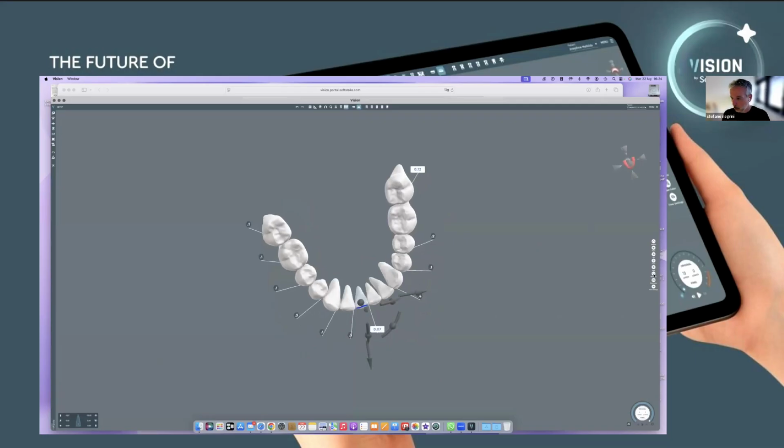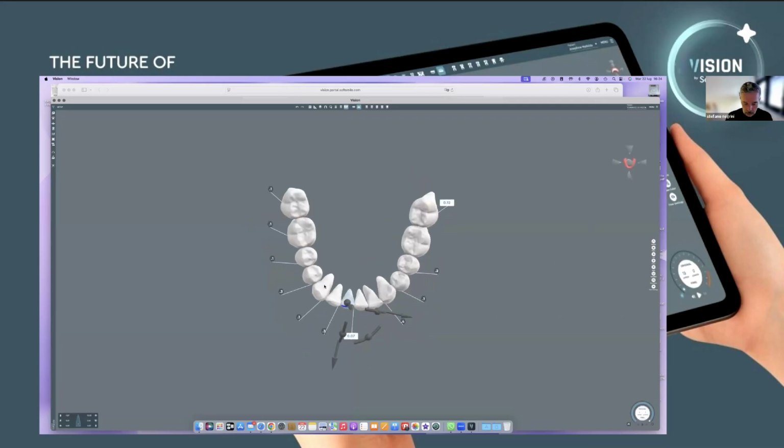Okay, now I want to increase a little bit. Stepping gear, just to go a little bit up, go down a little bit. Is that 1.4? Okay, now I move this one a little bit. I want to create a space just to close a little bit up.